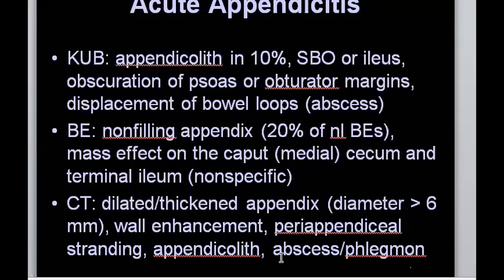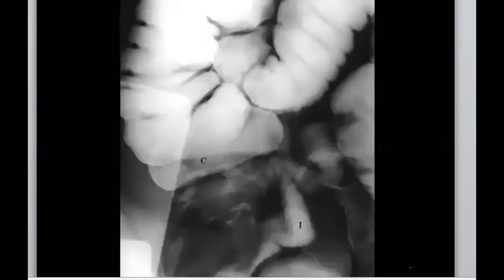And the complications. One of the complications again is perforation with free air, and again abscess formation, and so on, okay? In the barium, I don't think it is easy. They mentioned that there is a periappendiceal or pericecal abscess, and this abscess makes a mass effect.